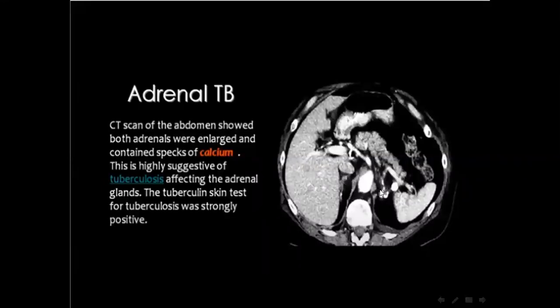Adrenal TB: both adrenal glands contain specks of calcium. This is highly suggestive of tuberculosis affecting the adrenal gland. The tuberculin test in this case was strongly positive. The case of adrenal infection proved to be TB.